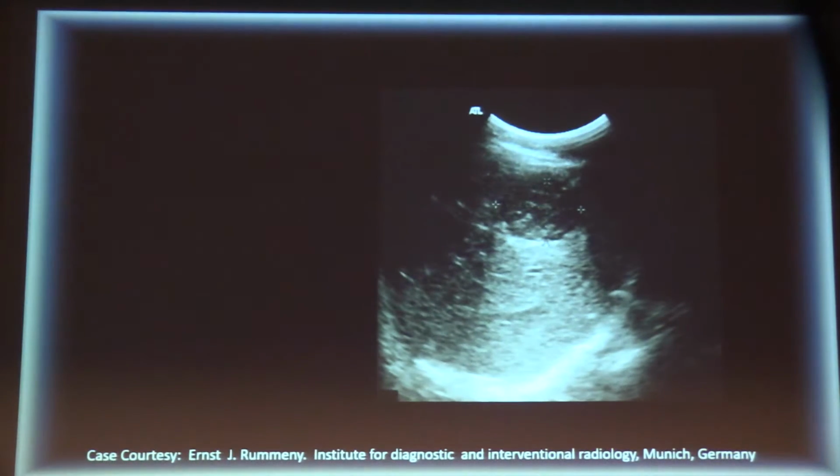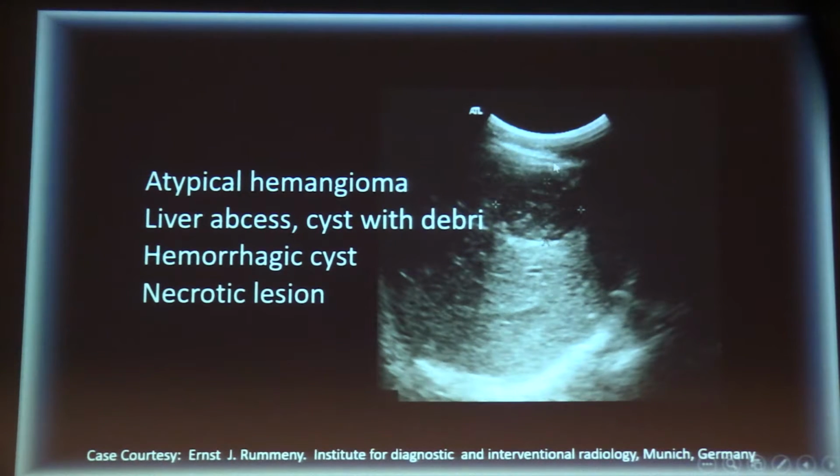Now, this is a patient who presents with this liver mass. And on ultrasound, this mass is hypoechoic, but it has some internal echoes within it. It is very well circumscribed, but it has posterior enhancement. So it does have some cystic appearance or characteristics. She goes for an MRI, or before that, let's discuss the differential diagnosis.